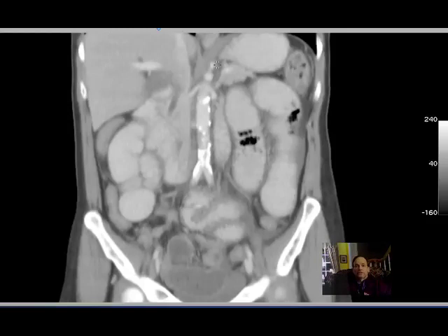Well, the reason is, this is the first branch off the abdominal aorta after it has passed through the aortic hiatus, and you would say that that is celiac artery, which gives off what vessels? That's a good question. Certainly could ask that. Hepatic artery, splenic artery, and left gastric.